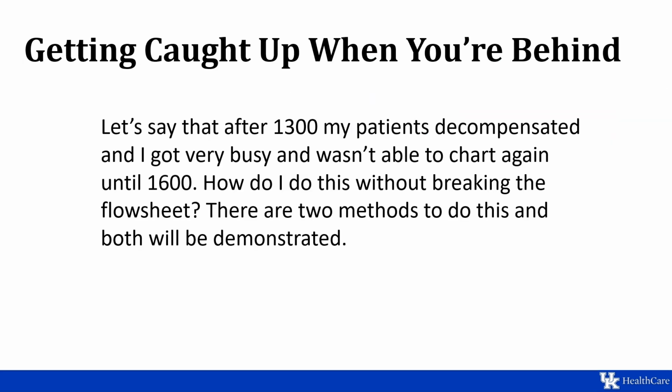Let's talk a little bit more about getting caught up in charting when you're behind. Let's say that at 1 o'clock, my patients got really sick and I wasn't able to chart on them, including Edna, until 4 o'clock. So how can I do this without breaking the flow sheet? There's two different methods, and we're going to demonstrate both of them.